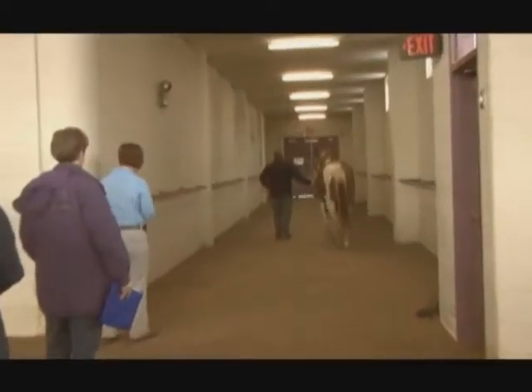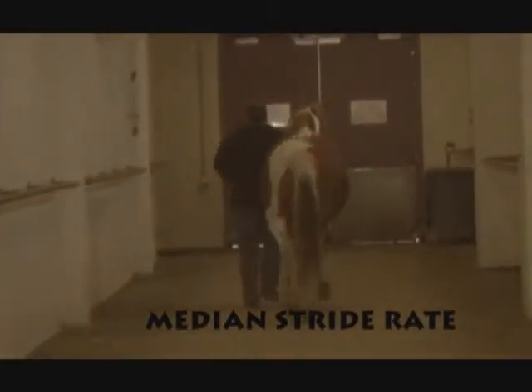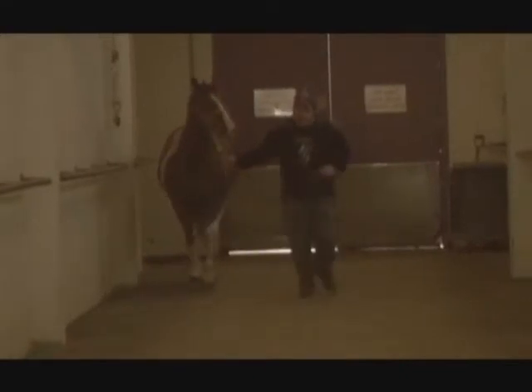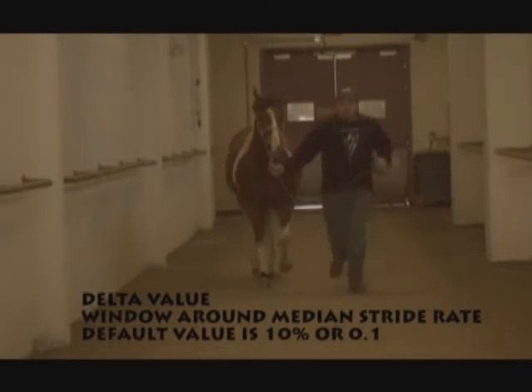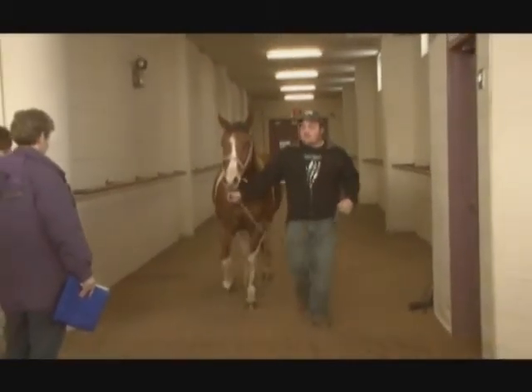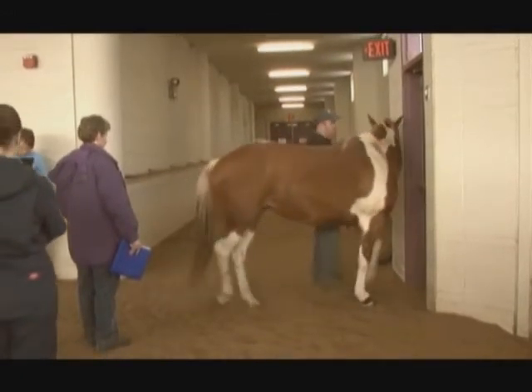Lameness Locator selects trotting strides by calculating the median stride rate over the entire collected trial. Strides that are within a certain percentage of this median stride rate are selected. This window is called the delta value, and the delta value is 10% or 0.1. As long as the most common gait during the trial is a trot, this approach is remarkably successful at picking most, if not all, trotting strides and not picking non-trotting strides during a trial.